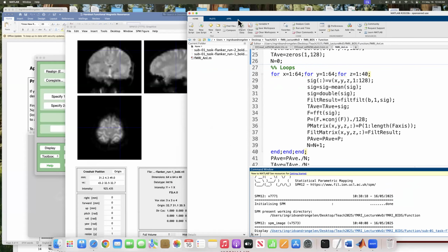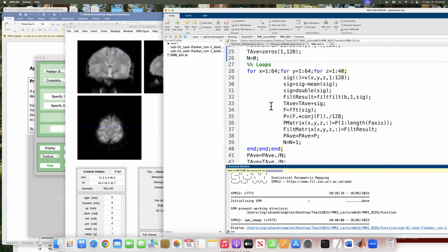So here you can see that we are going through a number of things. We demean the data. One of the things you have to do, once you are in Matlab, is that Matlab wants to compute with floats, with reals, whereas most of the data coming directly from the scanner are unsigned or signed integers. You can figure out what it is by looking at it.